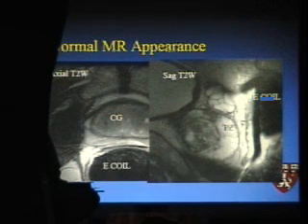Now, what does the normal male pelvis look like on MR? T2-weighted images, axial and sagittal. The prostate has 2 major parts that are visible in imaging. There's the inside and then the bit around the outside. So it's what we call central gland and the peripheral zone. Peripheral zone is the C-shaped white structure here, which is the high signal intensity glandular tissue, the place where approximately 75% of the cancers will start. So this is our kind of primary area of interest, this the PZ.